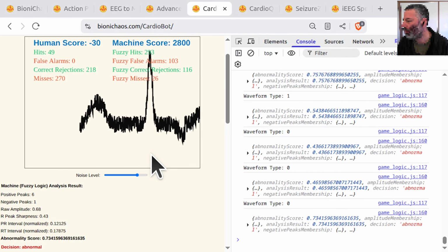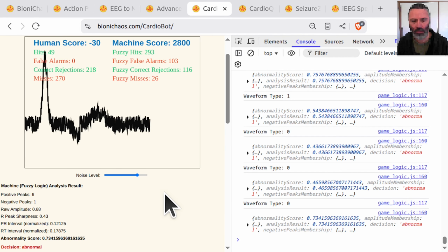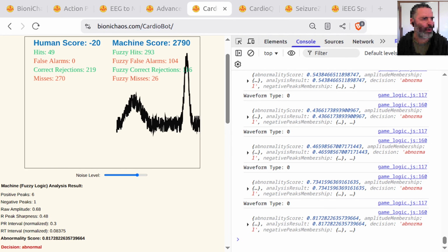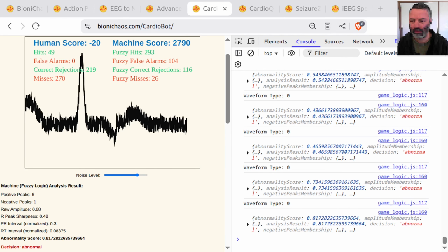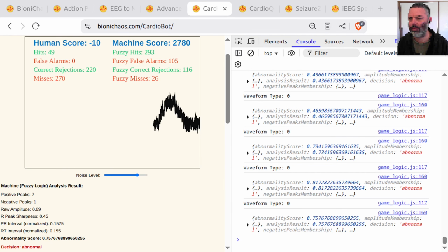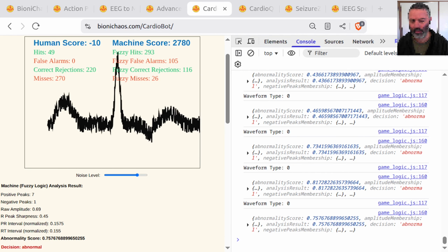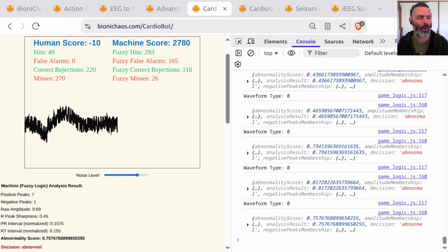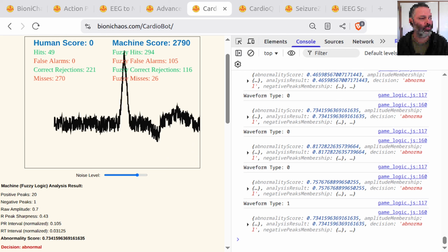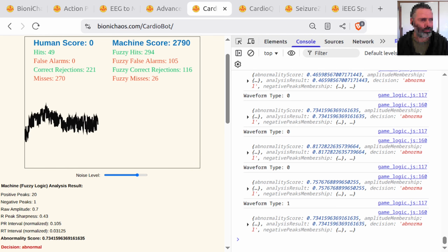How do we get that muscle in the browser? We use the strengths of the modern browser. For the core math, we leverage Math.js. It handles all the vector and array operations we need. More importantly, we directly implement the peak detection logic in optimized JavaScript. The find peaks algorithm using the median absolute deviation, MAD, for thresholding, is a well-defined process.